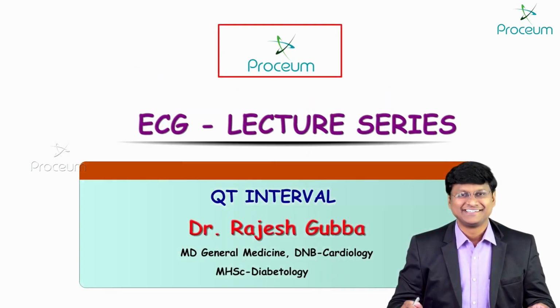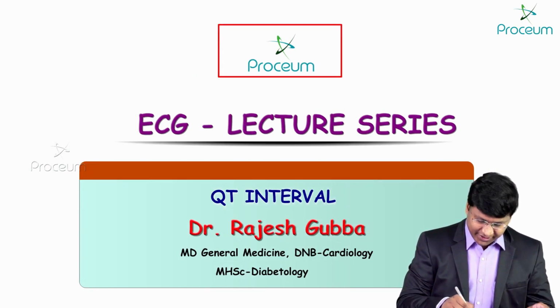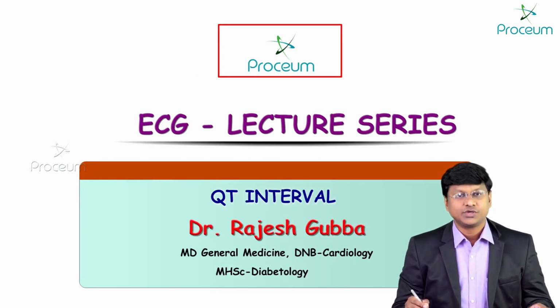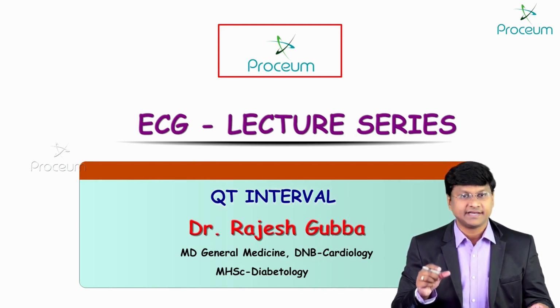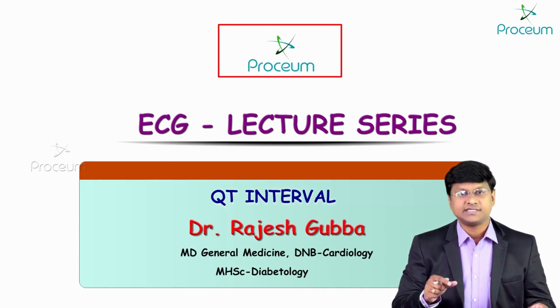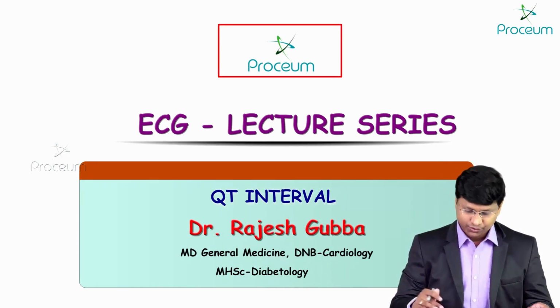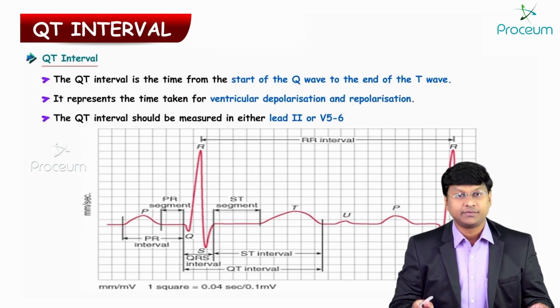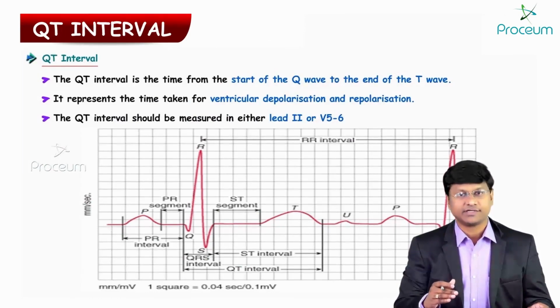Hello everyone. As a part of the continuation of the ECG lecture series, in this session I will be discussing the QT interval. First of all, let me tell you what it exactly represents, and in the ECG complex where it will start and where it will end. The QT interval represents the time taken for ventricular depolarization as well as repolarization.